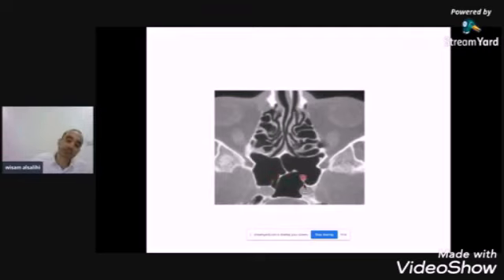More cuts showing the labyrinth, anterior and posterior ethmoid, and you can see the nipple of Kennedy here, and the anterior ethmoidal artery. More cuts showing the ethmoid anterior and posterior, and the sphenoid more posterior. More cuts showing the cribriform plate and the lesion. In this cut, we can see the frontal sinus and the frontal recess in the same plane. More superior, can we see the frontal recess? We can examine the anterior and posterior table.